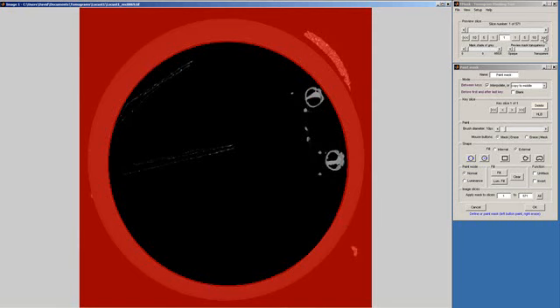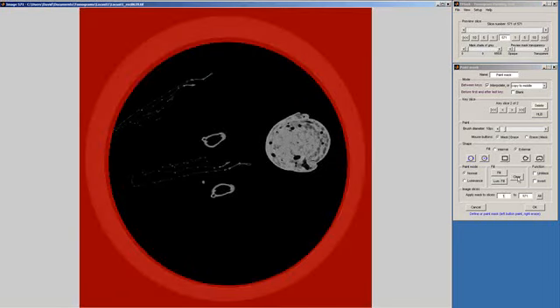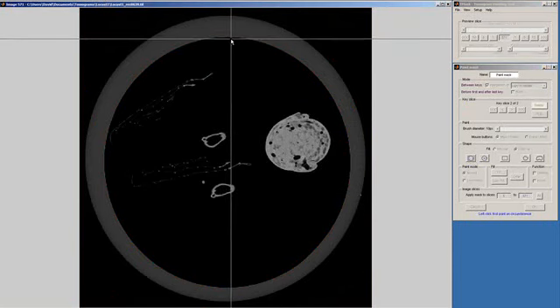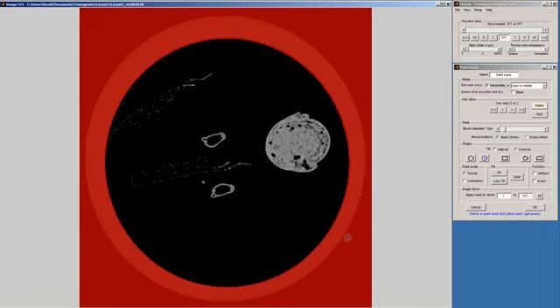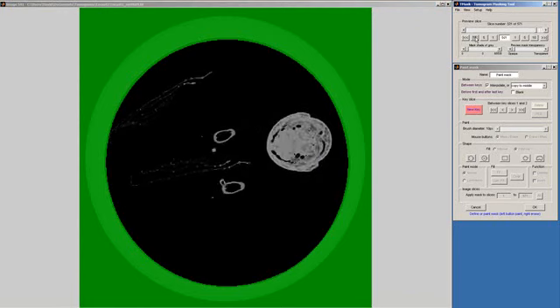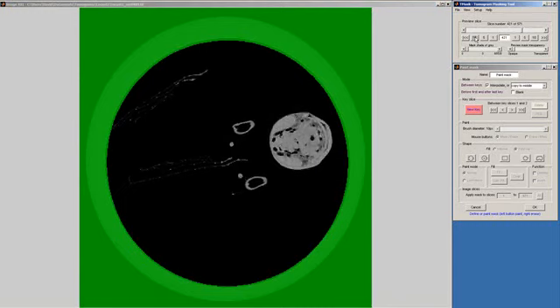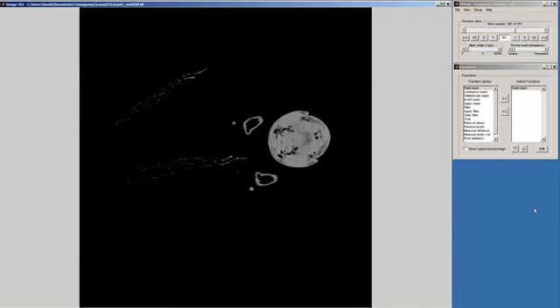I now move to the end of the dataset, define a new key, clear this existing mask, and draw a new mask. Again, 3 points inside the tube, like so. And now if I step backwards, say in steps of 10, we can see that the tube has been covered by the green mask. Click OK to apply the mask, and the tube has gone.